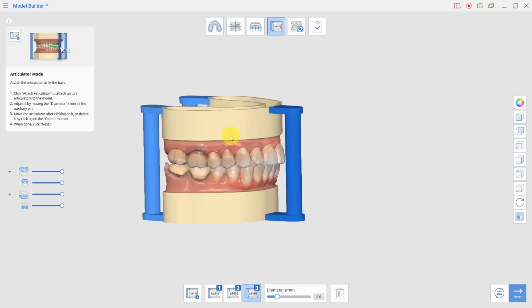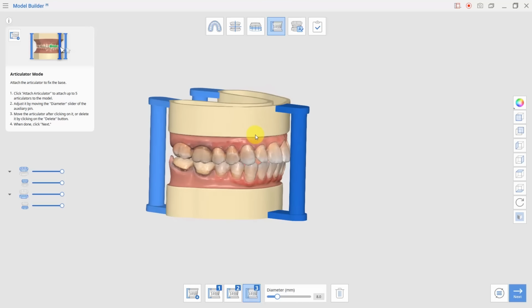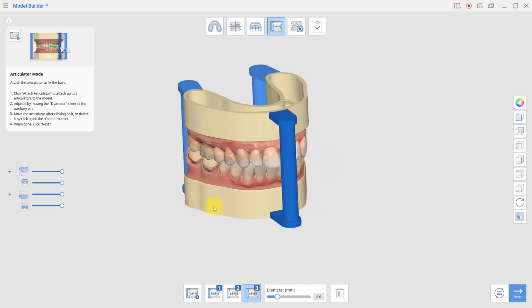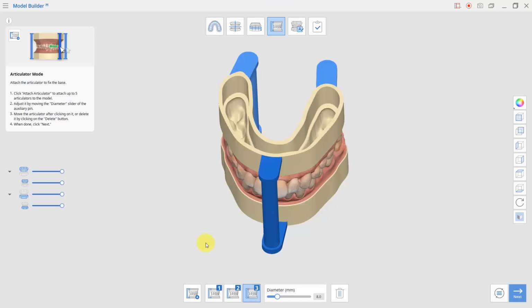The articulator-based function allows us to do some very interesting things in either restorative dentistry or prosthetic dentistry. Utilizing an articulator pin allows us to articulate dental models, whether they have natural teeth or situations where you might have edentulous arches or a compromised dentition with only limited teeth to provide a physical articulation function. Articulator pins can be modified based upon their position on the arch, whether at the midline or at different positions of the dental arch. The software automatically builds the articulator pins in, and models can be 3D printed with or without the articulator pins.